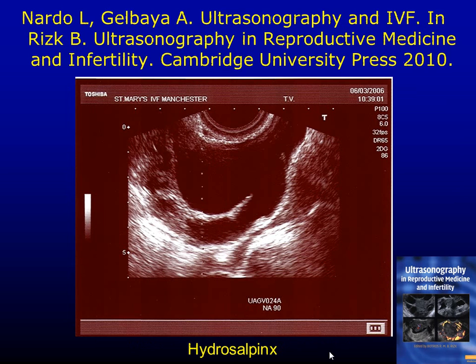So I mentioned to you the hydrosalpinx, and this is for our residents, a very important thing. There is never a hydrosalpinx that's rod like that. There is never one hydrosalpinx that is one, the end of the tube is closed here and this is a sausage. It coils around itself 2-3 times. So once it coils like that, you do the ultrasound, it has this C appearance. The C is not complete, so you don't have a full circle like a cyst. So it is tricky when they read it to you as a cyst and you go in as a hydrosalpinx.